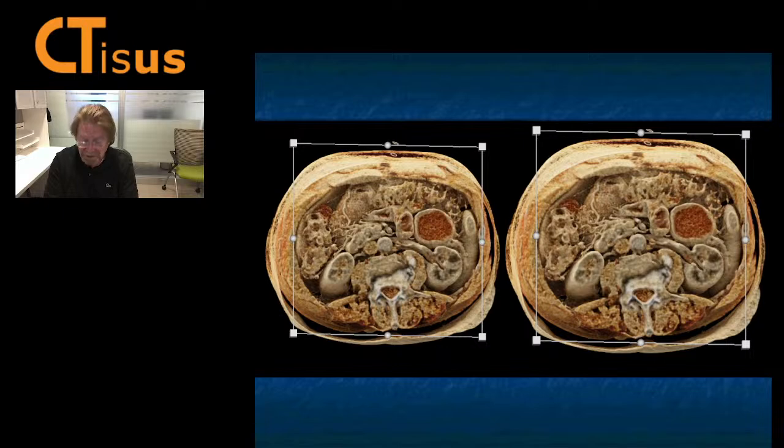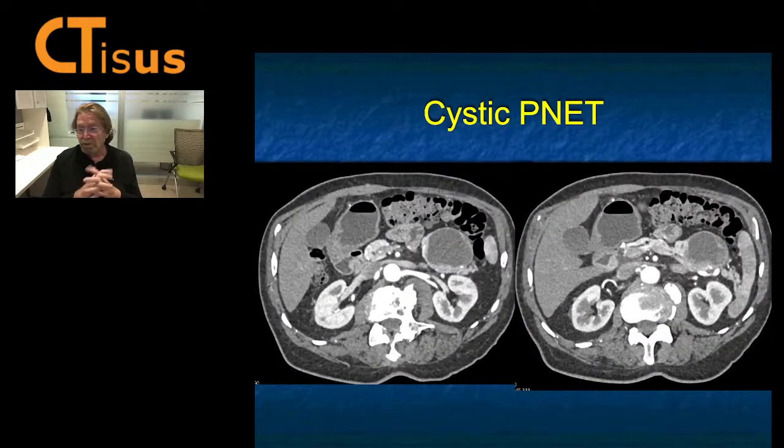So now you say to yourself, cystic lesion tail of pancreas, wall thickening. Okay, mucinous cystic neoplasm, yes. IPMN with malignant dysplasia, yes, but it's too much symmetric thickening. It's not your typical eccentric nodular lobular thickening. But we always got to think about neuroendocrine tumors. We've talked about how neuroendocrine tumors of the pancreas are typically hypervascular, but also that they're sometimes hypovascular. They commonly calcify, but they also can be cystic. They're cystic with a thickened, enhancing rim with often nodularity. So this case, my friends, was a cystic neuroendocrine tumor.